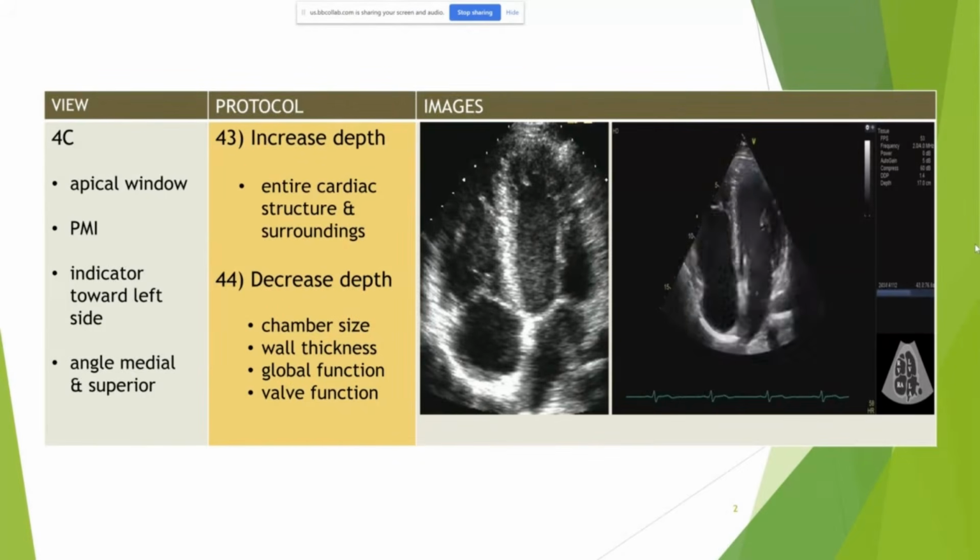But just know that it is a condition in which the heart's ability to pump blood decreases because the heart's main pumping chamber, which is the left ventricle, is enlarged and weakened. So you want to remember that in some cases, it's going to prevent the heart from relaxing and filling properly, so the heart is going to appear more round. But this is correct orientation with the right window, and also with it appearing kind of oblong, more oval than round.